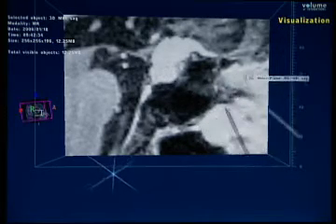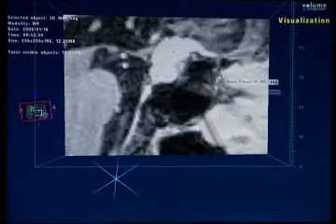So we use some semi-automatic segmentation to segment the lesion on top, making use of the threshold, which is between the upper part of the lesion and the frontal lobes, and we use some manual refinement between the gland and the meningioma.